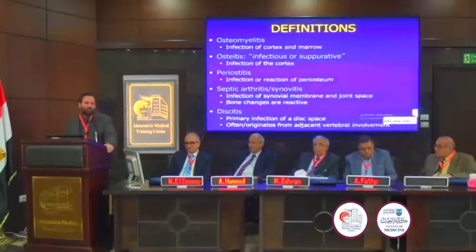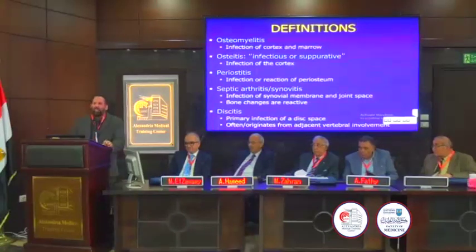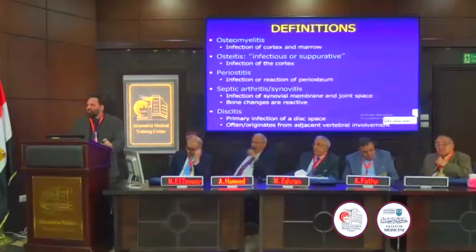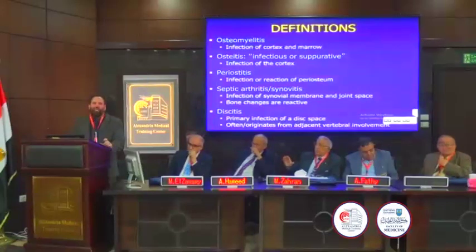So this is a case of a spinal infection. Note the preservation of the disc space, which will help you distinguish TB, which this is, from typical pyogenic infections. So we begin with the Latin, and the root of the word is the part of your body. The end of the word, the suffix, is always itis.